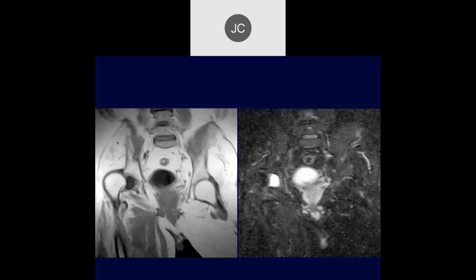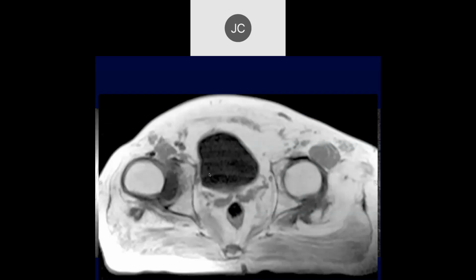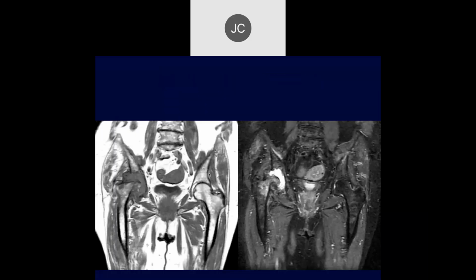Okay, so here we see bilateral muscle atrophy, worse on the left. Deformity of the right hip joint. Could this be, again, polio? Yeah, again, polio with marked muscle atrophy. With that, you get instability of the joints because you can't control the muscles anymore, and you can get instability patterns like this.